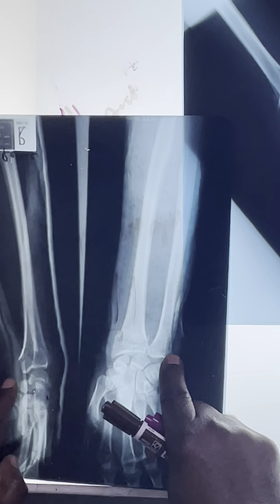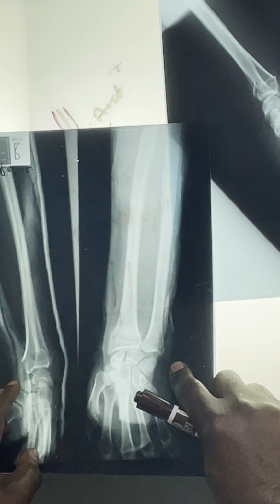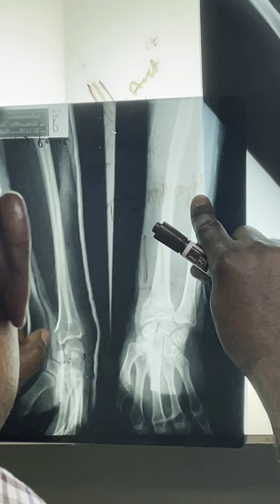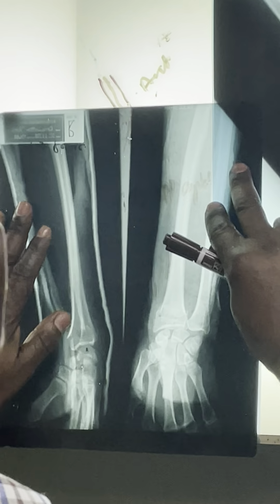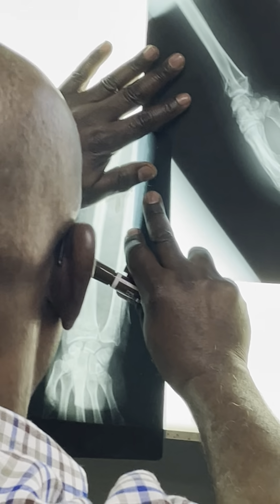Right? So you can see there's still some lateral shift here. It's not perfect. Yeah. And you can see also, look and see the cortex now. You see how the cortex again is not perfect. So you know it's not perfectly rotated around. Yeah? But you can see the proximal fragment is still there. Alright. So, as I said, that is the way you would describe it.